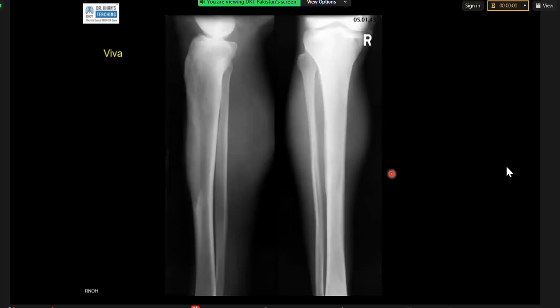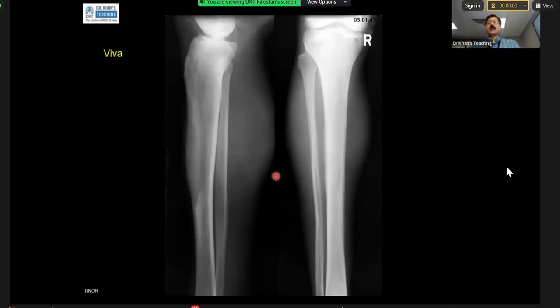Also, there is no cortical destruction, there is no cortical bone matrix, and there is no periosteal reaction. My differential diagnosis: this is a classic appearance of blade of grass sign and representing Paget disease. Excellent, well done. Now, the lytic phase of Paget's disease, at times, those candidates who haven't seen it find it difficult to diagnose, and this is the example.